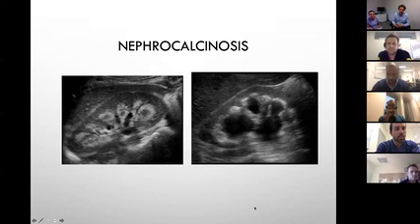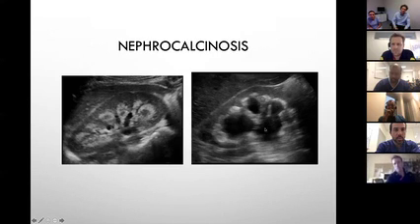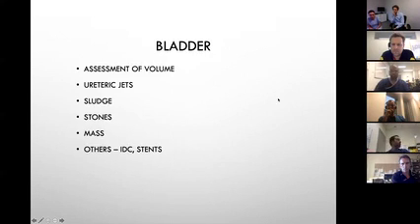Okay. The second image, will you call that hydronephrosis? There is some hydronephrosis. You can see a little bit of shadowing coming in, but these are all dilated systems. They're all communicating. That's hydronephrosis. I would say moderate. The cortex is still reasonably okay.